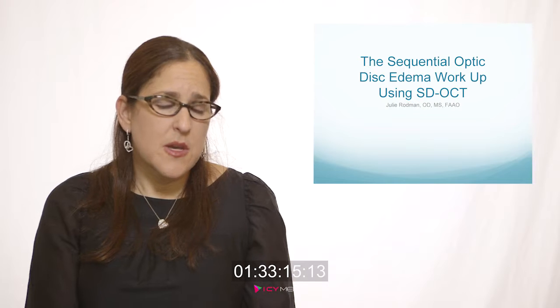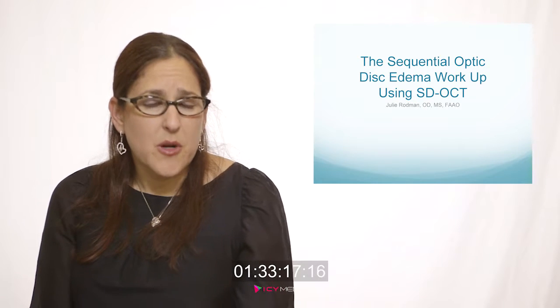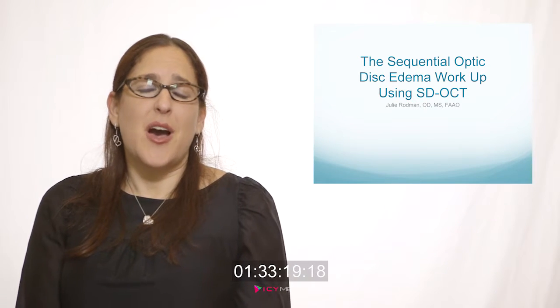The purpose of these webinars is to introduce you, or to help you, to incorporate OCT into your practices for better detection and management of patients with different ocular conditions. I'm Dr. Julie Rodman, and I'm going to walk you through this presentation on optic disc edema. Again, we're going to talk about how we can best use OCT in our practices for various ocular conditions. In this particular webinar, it'll be optic disc edema.